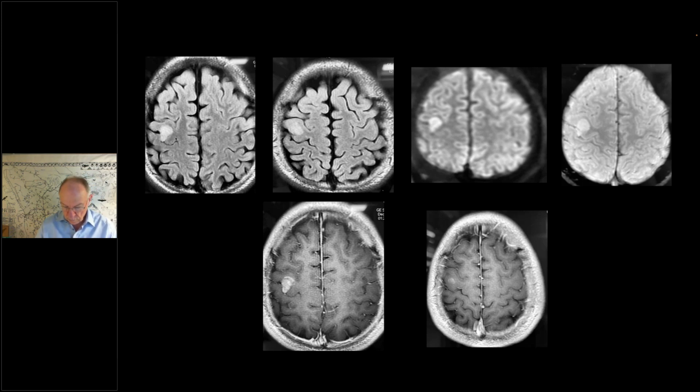Okay. So you have non-contrast FLAIR images. You can appreciate that the cortex and subcortical region demonstrate hyperintense foci in the right posterior frontal region. It demonstrates a corresponding area of restricted diffusion, no mineralization or calcification or foci of blooming on the SWI images. Post contrast, there is a moderate degree of enhancement. And these are the only set of images I have.